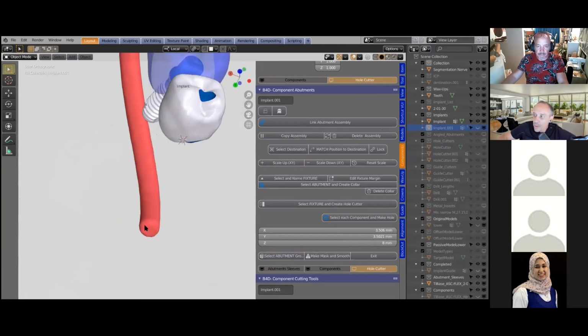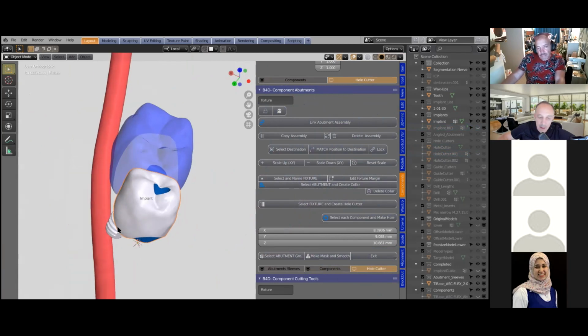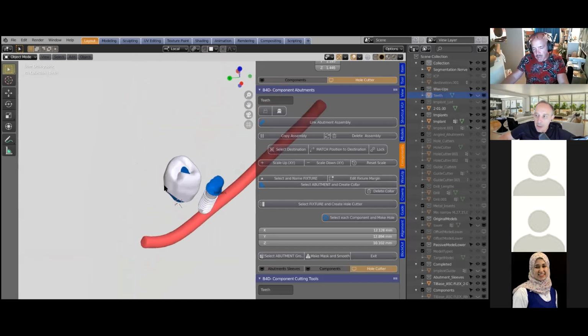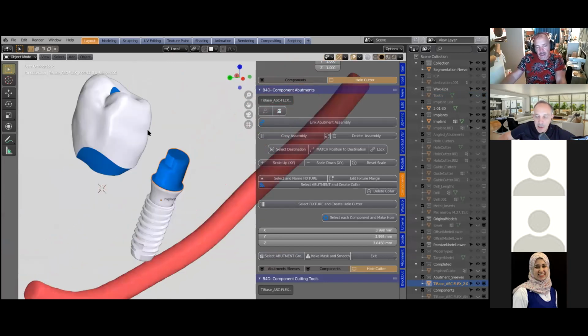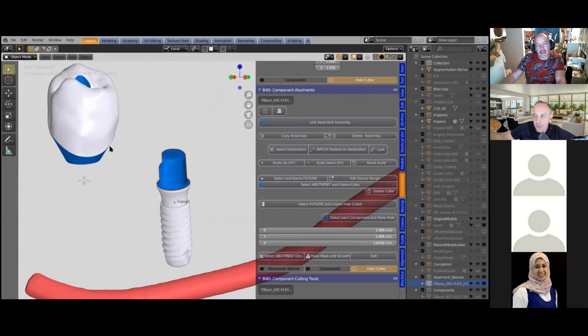And the other question was if we can add a scan body of the root. Well, that would follow the same process, wouldn't it? It's the scan body of the root. Okay, so just a mere scan body, is it? I think we're talking about the root, the root implant system. But you do exactly the same. You'd select the destination and match position, and you'd be able to get the scan marker into the scene. It would follow exactly the same process.